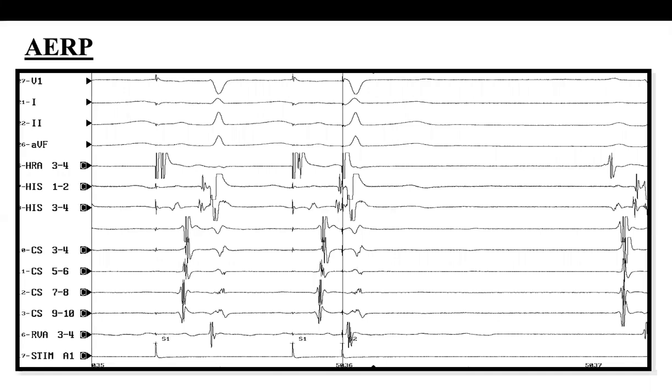Definitely. Dr. Ahmed, in the right ventricle there is the S2, there is a wave in the right ventricle. So this is not paced. This is normal, so this is the native. This one, for example, is related to this one. So it's the same as this one. So the atrium, ventricle, and this S2 here. Timing, it doesn't matter whether you put it before the atrium or before the ventricle or after the ventricular activity. But here, because we are putting it very early, to the extent that we are getting it before the ventricular activity, that tells you we are really too early to be able to stimulate the atrium.